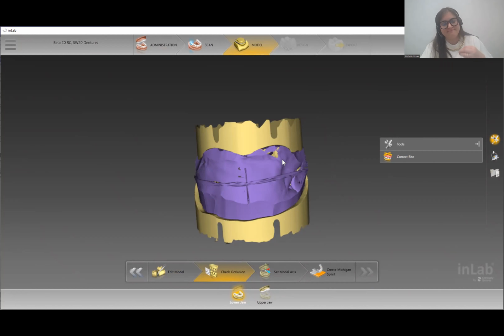So because of that, make it easier for yourself, just do one scan at a time, send through to the portal. And then when you download each individual case, you can design the upper tray, the lower tray, whatever it might be. So that would be my recommendation.